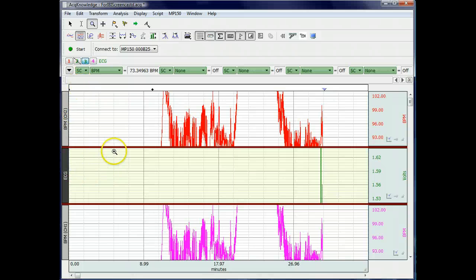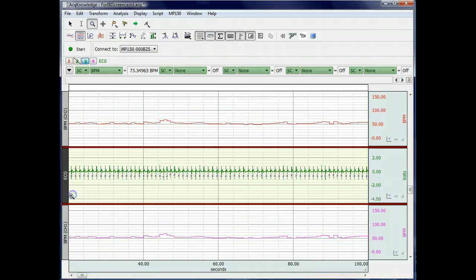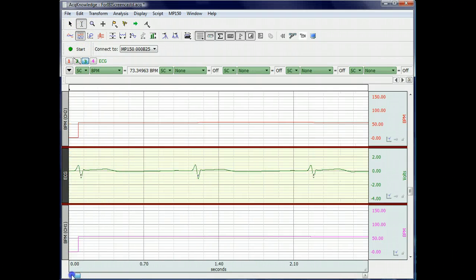Okay, so what we can do, knowing that each S wave is preceded immediately by an R wave, place a cursor at the beginning of the file again. We can run FineCycle.